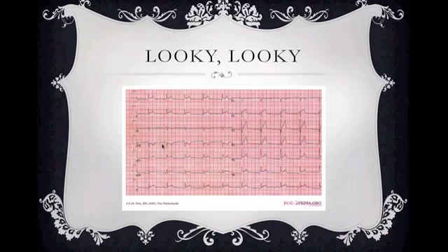Looking at my whole EKG here, I see elevation. Not in 1. We're not looking at 3. Remember? But we have elevation in V2, in V3, in V4, V5, V6. I have global ST segment elevation. But look at AVR. I have ST segment depression.